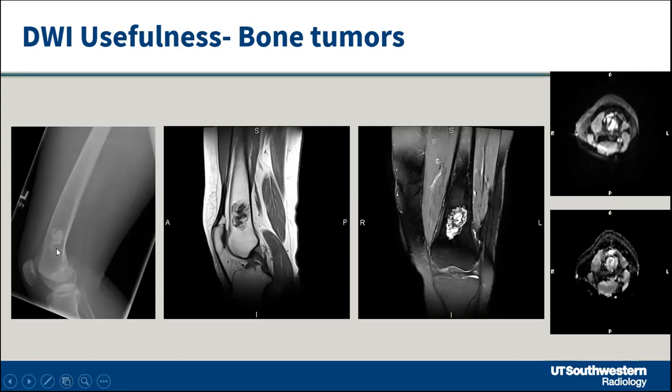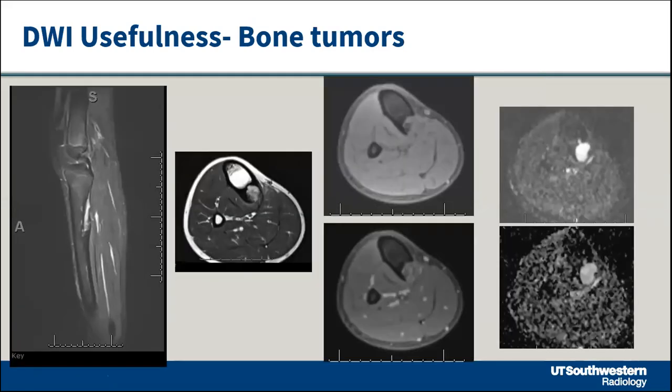This one is also an easy lesion where you see this punctate calcification. It's a chondroid lesion, has some lucency around it. And here is that lesion on T1 images. Here's the lesion on T2 images, or T2 FATSAT. And then if you look at diffusion ADC, it's a bright lesion. Most of the enchondromas you're going to see have very high ADC values, anywhere from 1.6 to 2.7, quite high. Some I have seen up to 3 ADC values also. So enchondromas are quite bright.